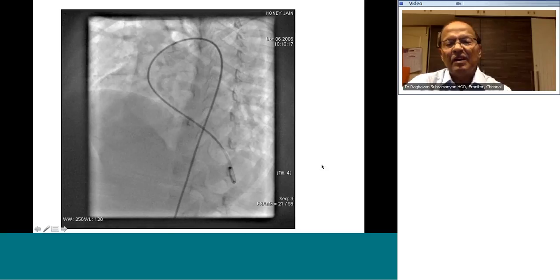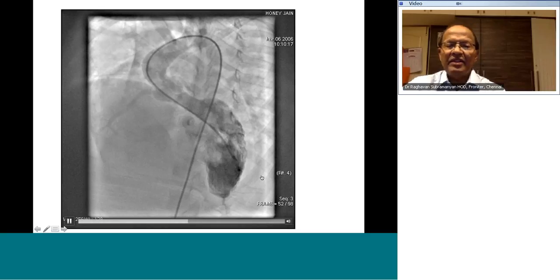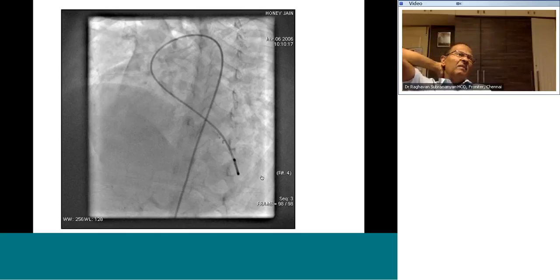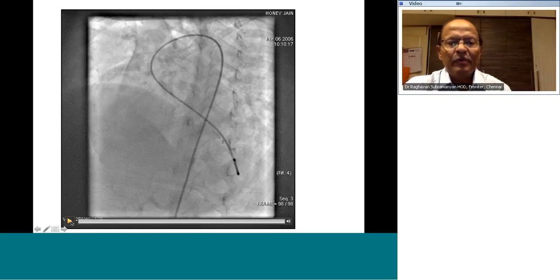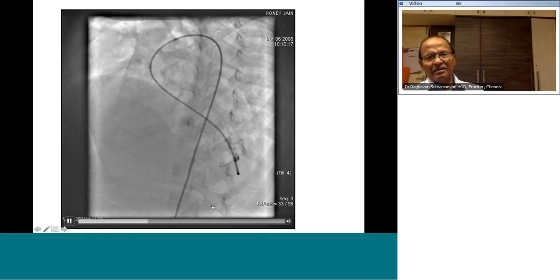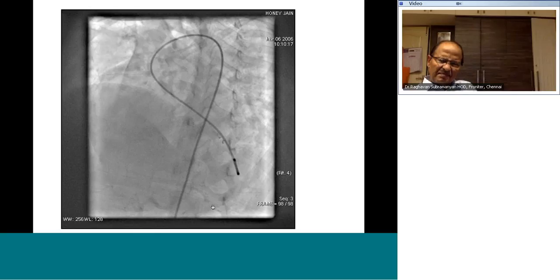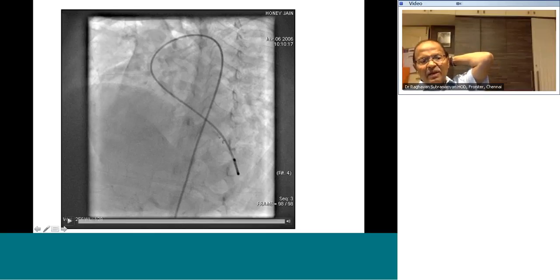Okay. Now can somebody describe this angio? What do you expect? They barely got another 10 minutes to go. What view and what angio? I told you how to identify views a short while ago.